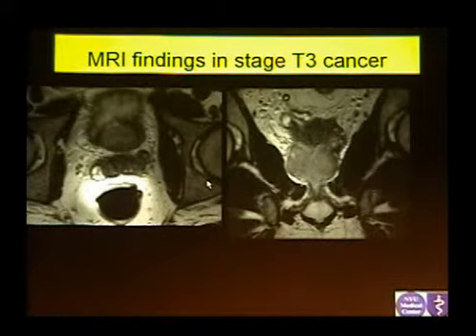A little bit gross, so this is more easy to detect. You see obvious soft tissue tumor. Remember that seminal vesicles should be always bright on T2. They contain fluid, okay? If you see dark seminal vesicles, always be suspicious, but it doesn't mean it's always tumor. It could also be hemorrhage, okay?